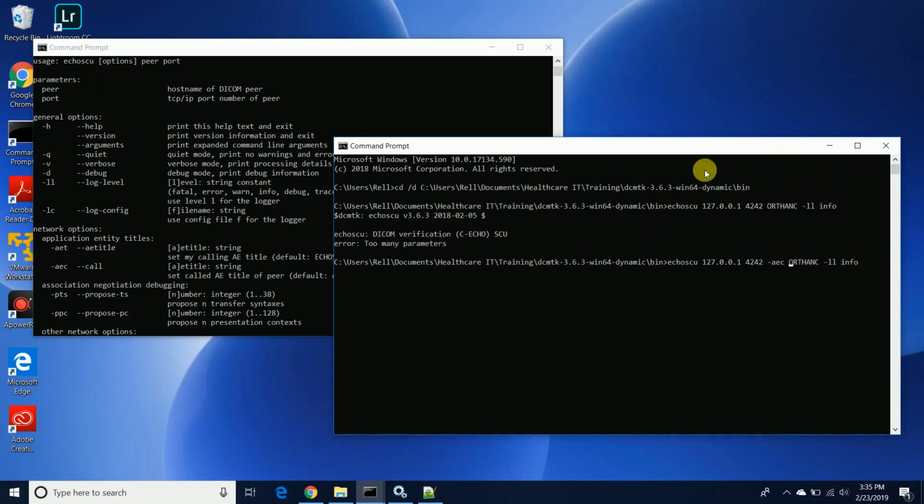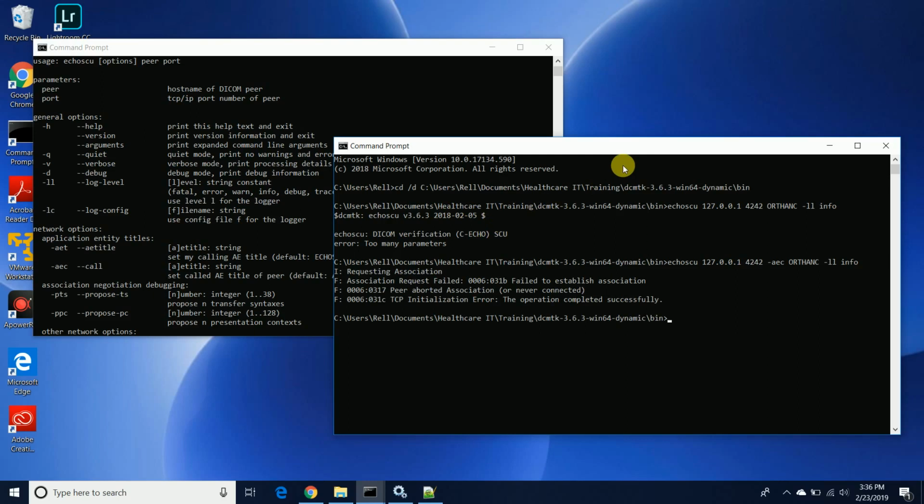All right, so set the called AE title here. Okay, so right here, this lets us know that the echoscu command actually requested association. The association request failed. It failed to establish an association, and then the peer, meaning the SCP or the destination, actually aborted their association, or it never connected.